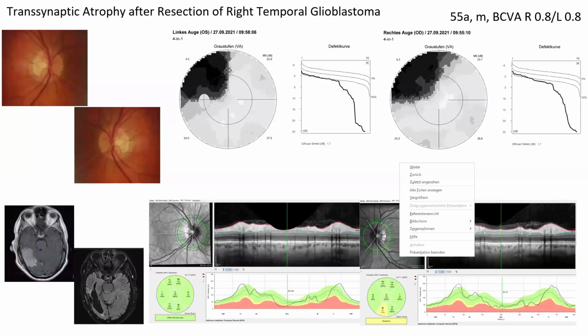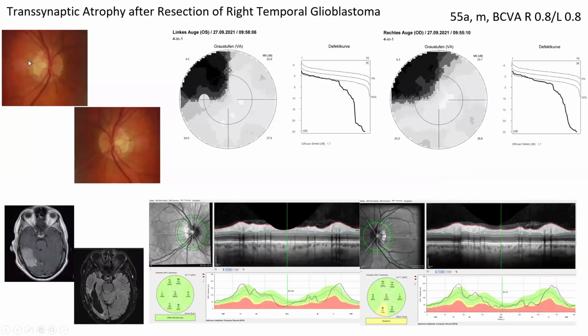When you look at the visual fields, everybody will realize this is not quite normal. When you look at the optic disc of our patient, just a moment, I get my cursor again. Yes, you will see a very faint pallor, not looking like glaucoma, of course, in the visual field, with the homonymous defect to the upper left hemifield.